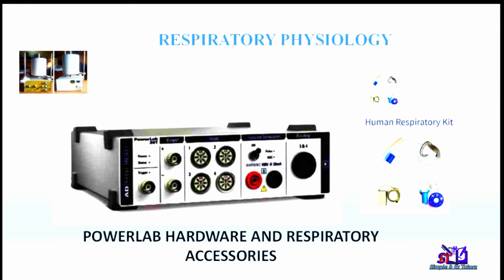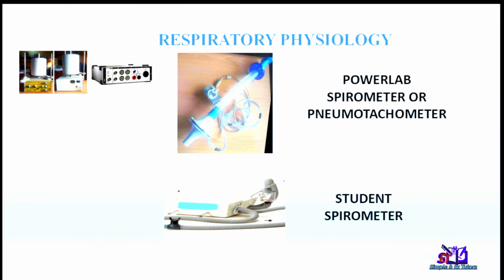This is Powerlab hardware and respiratory accessories. It is a very versatile, modern instrument that replaces Kymograph, and it can be used to carry out different experiments in physiology and various fields in the medical line. These are the respiratory kits for Powerlabs. This is the Powerlab spirometer or pneumotachometer, and this is the student spirometer.